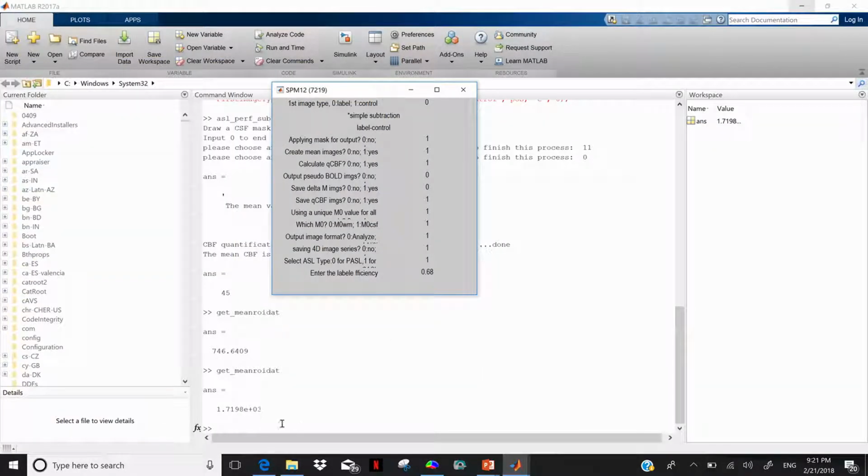For example, if I'm using it, I don't know if I'm doing it right or wrong, whether my results are matched, whether others are getting the same results, or whether the software is detecting only the machine thing. You really don't know, so there is no standardization yet. But this is open source software, right? Now what I've done is I have taken a combined ROI, so let's see whether we get the same results.